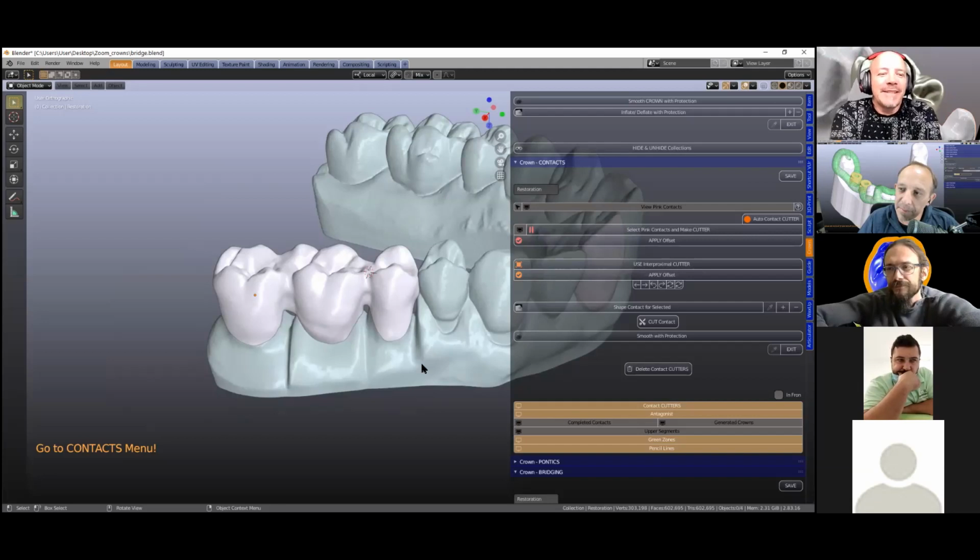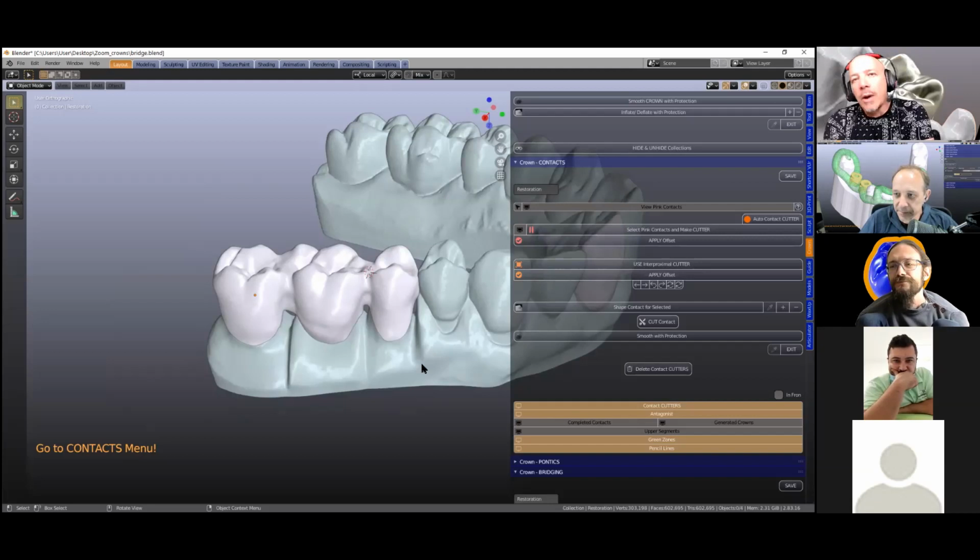When I first developed the articulator, this is exactly what I thought. The problem is the upper model, because if you want to trim a lower splint or crown or whatever, you don't have the upper model that has been moved, so that we've got 13 models to merge them into. Do you know what I mean? So it'll work with the lower, but it won't. I did all of the scripting and the coding for the entire section. I moved to the upper and I called Wolfgang. Oh, this is not going to work. Yes, I was not thinking about the upper one.